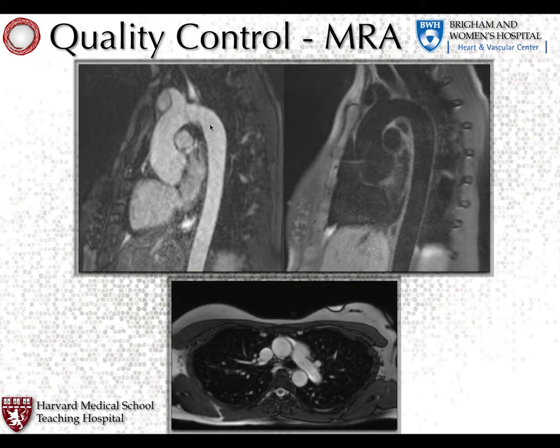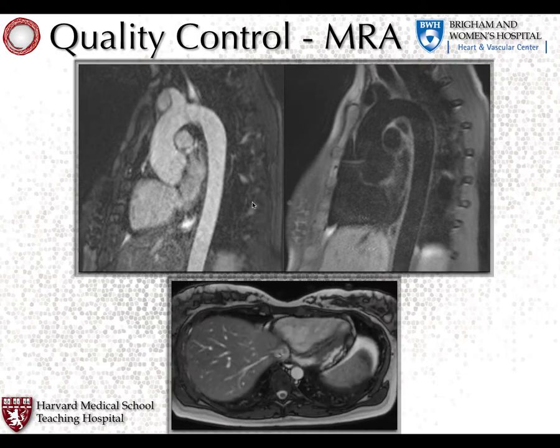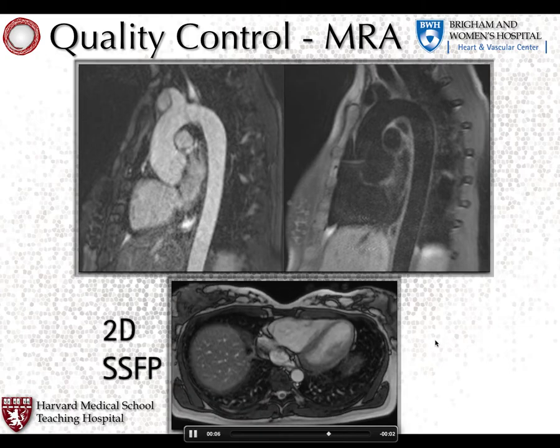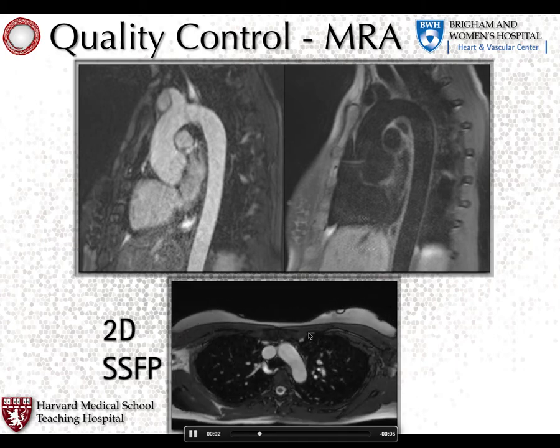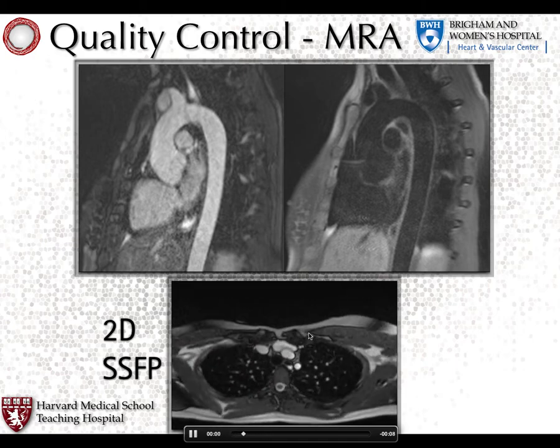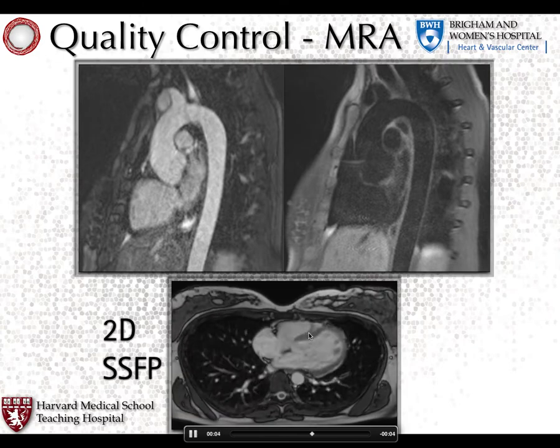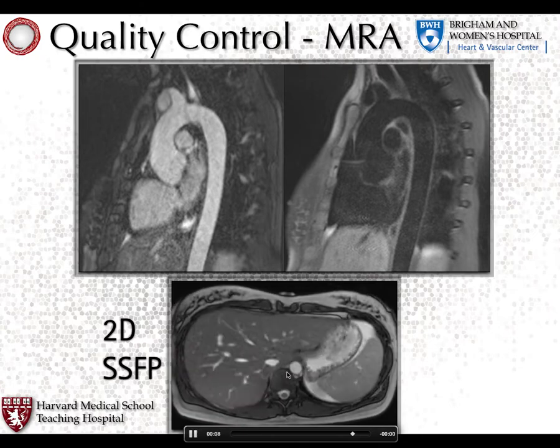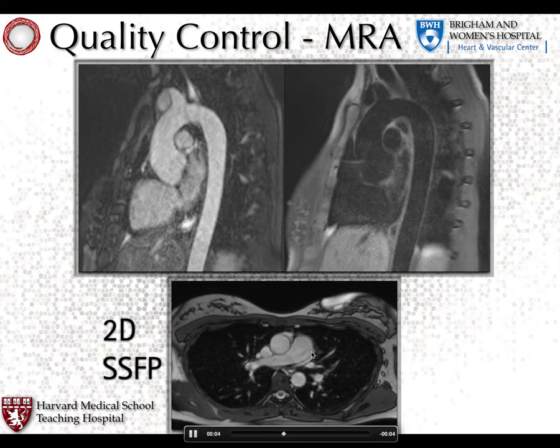Here are some more examples of very high quality MRA that we can do. These three are different techniques. They're all non-contrast techniques. First, and our easiest technique, is to take the pulse sequence that we use in cardiac MRI and, instead of using 25 phases of the cardiac cycle, we get 1 phase and run it free breathing through the chest, and that's what we're seeing here. The temporal resolution of any given slice is on the order of milliseconds, so we don't see blurry motion.